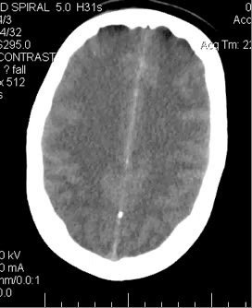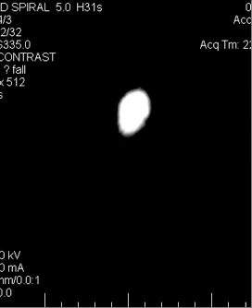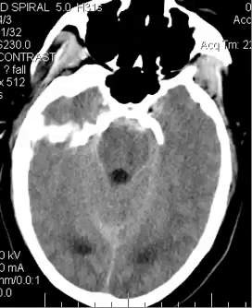Hello, it's Dr. Mintz. I wanted to go over a case of a patient with subarachnoid hemorrhage, and this is a 50-year-old female. And we'll just get a quick overview here first.